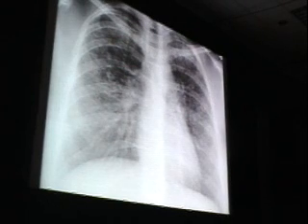All right, moving along, we should all recognize this, and here in the South we see quite a bit of this. This is sarcoidosis in its stage 1 form, characterized by generally symmetrical, although this is a little asymmetrical, hilar lymph node involvement of both hilar and the paratracheal nodes as well, reflecting mediastinal involvement. But as this disease progresses, it moves from this to this.